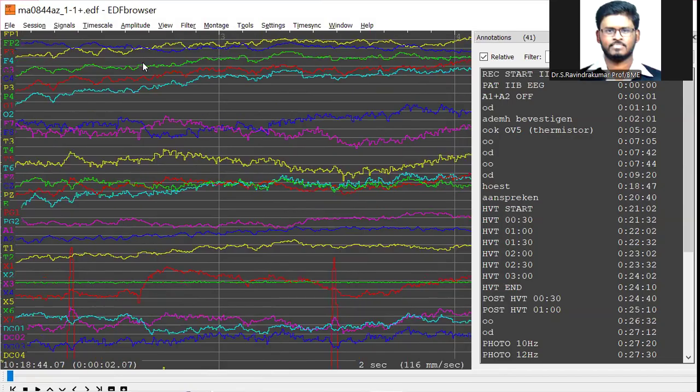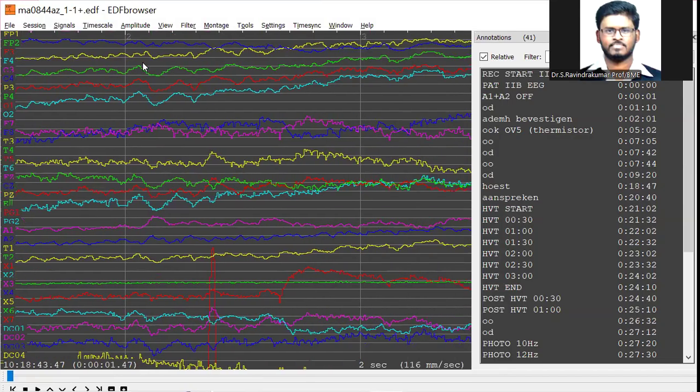All this is on a single screen, and you can see all the signals, and each signal has its own features. Whichever signal is required, you can keep those signals, and accordingly, for that signal and that time period, you can convert it into a CSV file and take it into MATLAB.